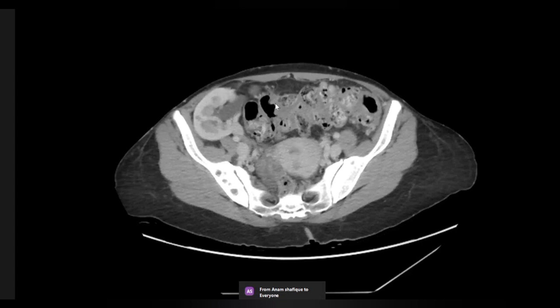So is there any history of transplant? Don't ask for a history unless you want to confirm the diagnosis. Okay, transplanted kidney. As a radiologist, if you want any prior history from the physicians to confirm, usually look for the hint from the images before asking.